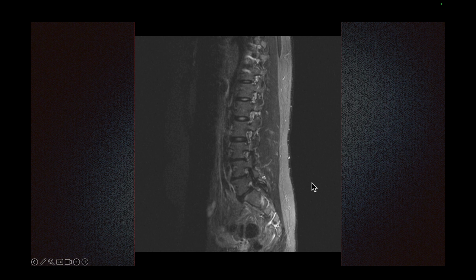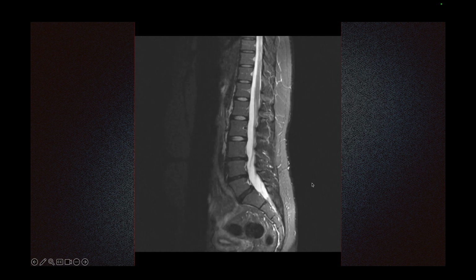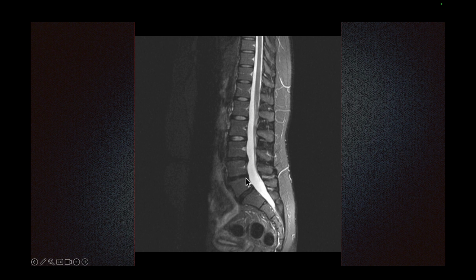Fracture of the pars is also called spondylolysis, and if there is movement of the vertebral body, anterior listhesis, we call that spondylolisthesis. In young patients, spondylolisthesis occurs mainly after fractures. In old people, spondylolisthesis can occur from arthritis of the facet joint without having a fracture. As we scroll through the image, we do see that there is mild anterior listhesis of L5 on S1. So this case has spondylolysis and spondylolisthesis.